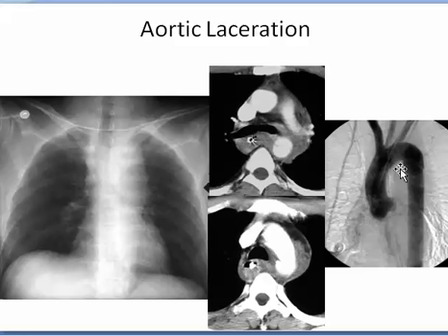Compression injuries result in aortic lacerations like this. You will find wavy outline of the aorta at the arch, and it is either intimal injury or swelling or laceration.